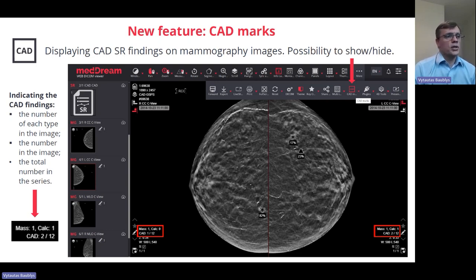And not only this function, the hanging protocols were also improved again to support better mammo viewing. Plus, thanks to our partners and advisors, we also created special functionality which moves all annotations and all demographical data to a side of the view, just not to cover any part of the mammography image. In my live presentation, I will also explain to all our partners how to configure and enable this, so your data would be moved and nothing would cover your image.